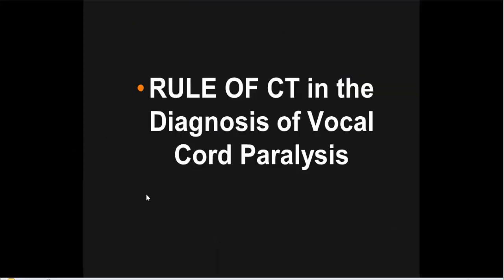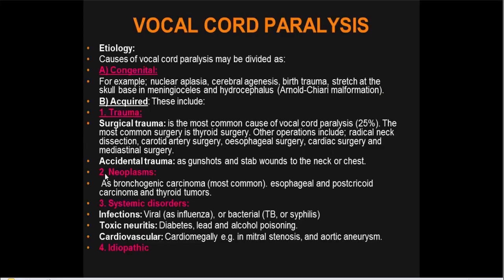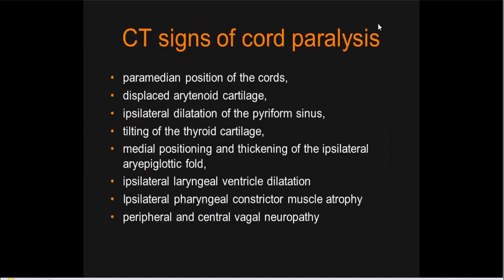Role of CT in the diagnosis of vocal cord paralysis. The etiology of vocal cord paralysis is either congenital, traumatic, neoplastic, systemic, or idiopathic. Now, the CT signs of cord paralysis.